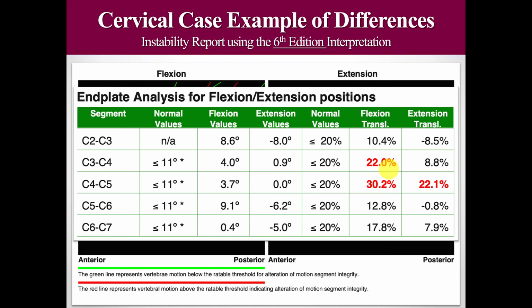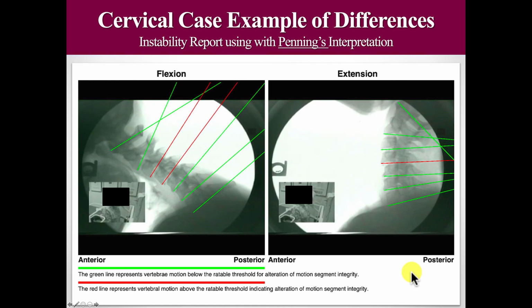You should be doing this, in my opinion, on every patient that you have flexion extension on, regardless if it was a PI case, workers' comp, who cares? If it was cash, Medicare, or a free case to a relative, to know is to measure on x-ray. If you don't measure it on x-ray, you're missing it, because sure as heck, your eyeball's not going to catch this, right? So the AMA guides caught that.